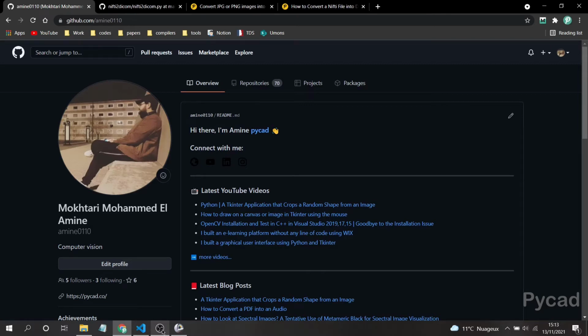can convert Nifti files into Dicom series. So if you remember, in this channel we talk about a lot of things about the Python programming language, C++ sometimes, machine learning, and medical imaging especially. So in this video we'll talk about how we can convert Nifti files into Dicom series. If you are searching for converting from Dicom series into Nifti files, you can find a video in the channel talking about that.